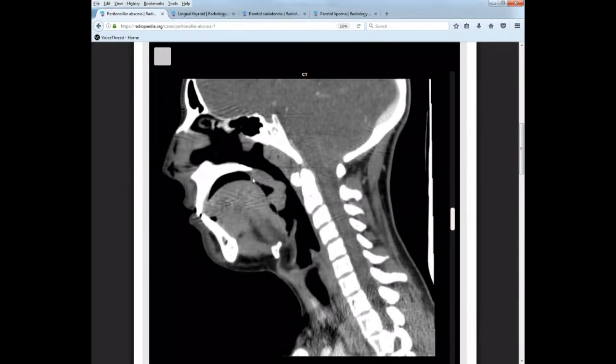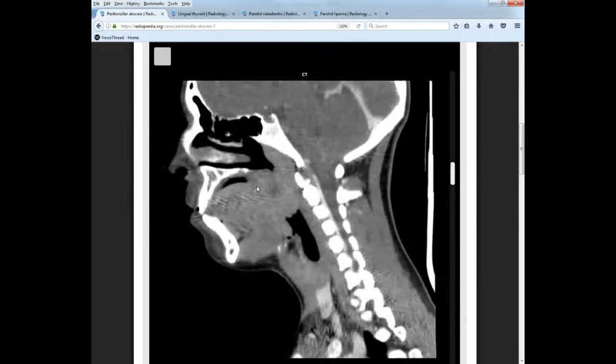So we have the borders, the posterior borders of the nasopharynx are the clivus, the anterior of the C-spine, the superior portion of the uvula on the soft palate. So this right here is hard palate, actual bone, and this here down to about here is your soft palate, okay? And this little guy here coming anteriorly, that's a little slice of the uvula.